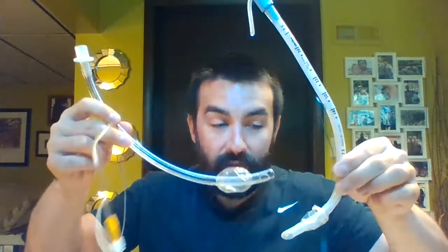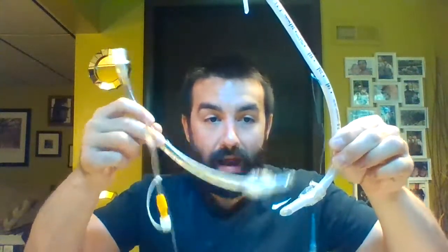And you can see I have a standard ET tube over here. We don't have that other adapter. You just got all the other same things we talked about, but you got a pilot balloon and a pilot line, no subglottic suction itself. Okay. Let's see, adult, what else do we have here?